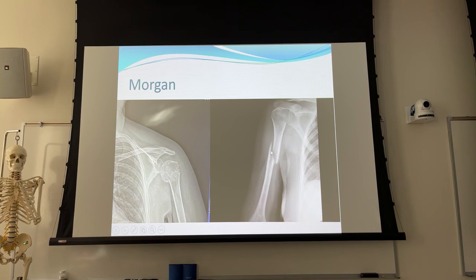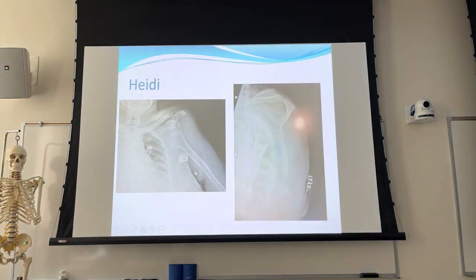This one looks a little younger. Yeah, they were younger. They're two different people. Same thing though, just fell down. People just falling all over the place. So, probably as much pathological fracture because of the weakening of bone, osteoporosis, in that case. So, any questions?